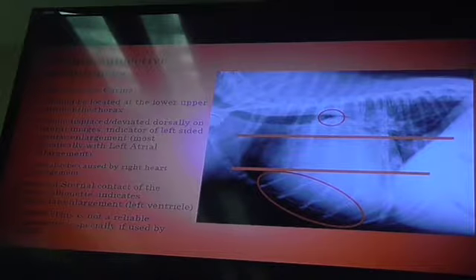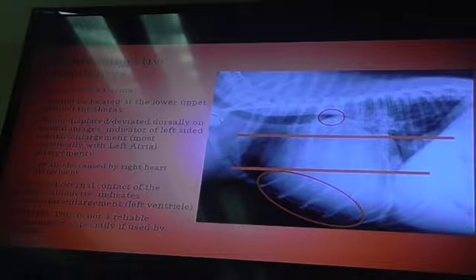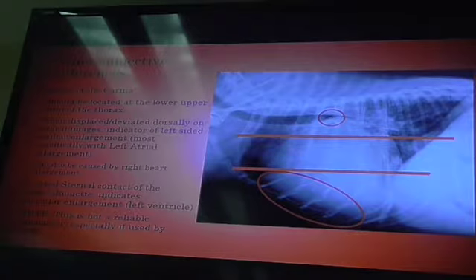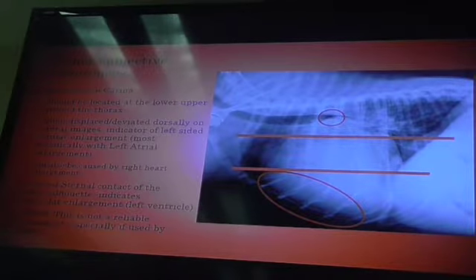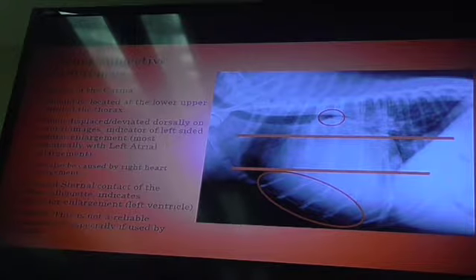Okay? Then, the one that, this one's a little harder, but when you have a case this severe, you can definitely depend on it. But a lot of times we talk about increased sternal contact. All right, that's going to indicate some type of ventricular enlargement, most commonly left ventricular. Okay, so this one isn't as reliable, especially by itself, but if you see it in a situation like this, you definitely can use that. And you're going to put that into your radiographic findings.